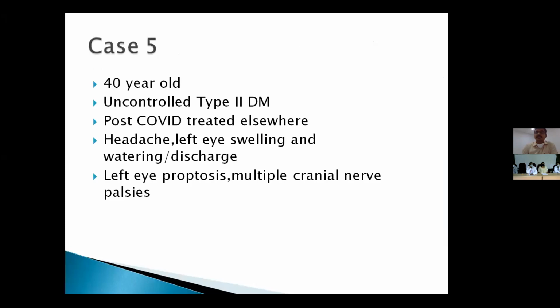So this is another case. This is a 40-year-old male patient, uncontrolled type 2 diabetes, post-COVID, treated elsewhere, but he came here for headache, left eye swelling and watering and discharge. On examination, he had left eye proptosis and multiple cranial paralysis. So we thought of fungal mucormycosis and we did an MRI for the patient.